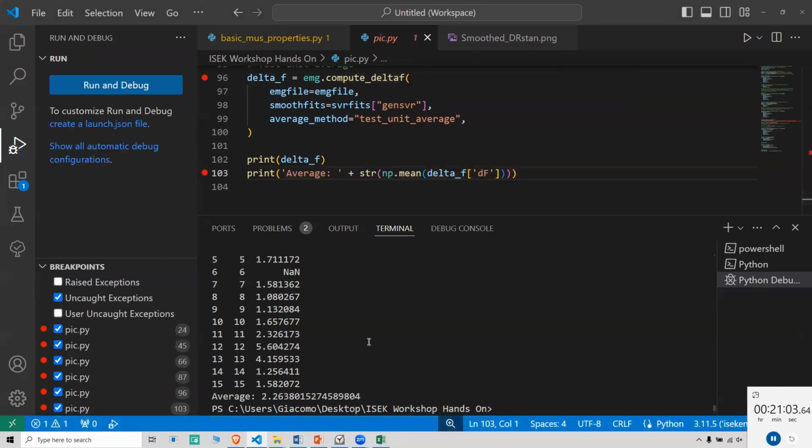And so once you get familiar with this, I think it's quite easy to see how in very few lines of code, there was a lot more code that wasn't necessary there, the plotting and everything. If you just wanted to quantify delta F, one function, output that, and you can loop it across data and then output it to CSV or whatever you wanted to get metrics for your whole study. So with that, thank you. Anything else?